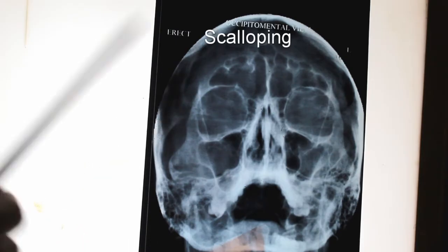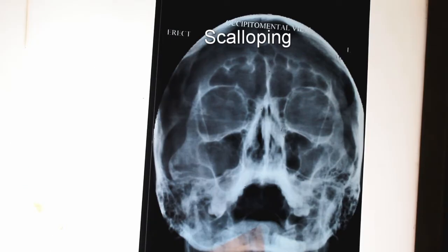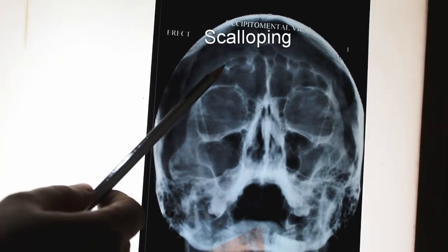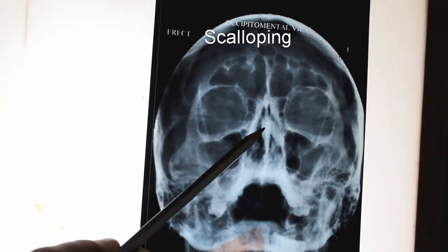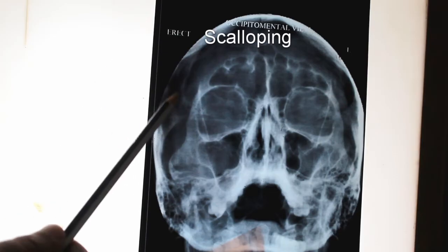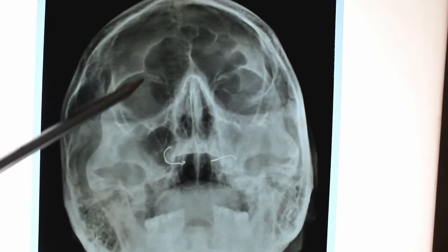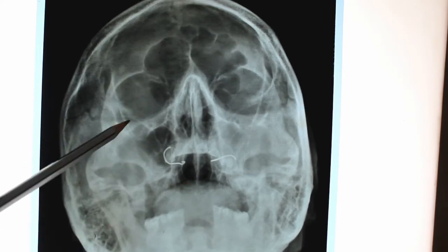X-ray appearance, a typical normal X-ray appearance of the frontal sinus. This appearance is called scalloping. Okay, scalloping view, meaning the outer shell. This is the scalloping view. This is normal, and the absence of the scalloping with expansion of the sinus cavity is seen in frontal mucocele. Okay, the paranasal sinus X-ray, occipitomental view with the open mouth.